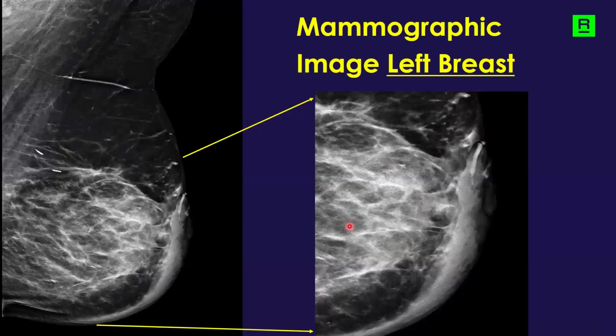All right, we have a MLO view of that left breast, and here are some surgical clips. This is her prior lumpectomy site. You can see diffuse skin thickening here, especially anteriorly, along with that nipple areolar complex. There's some increase of the trabecular markings. Could this all be due to her previous radiation therapy? There weren't any priors for comparison. So what are you going to do next? It could be any of those possibilities in that differential. So do an ultrasound. Go to your toolbox.